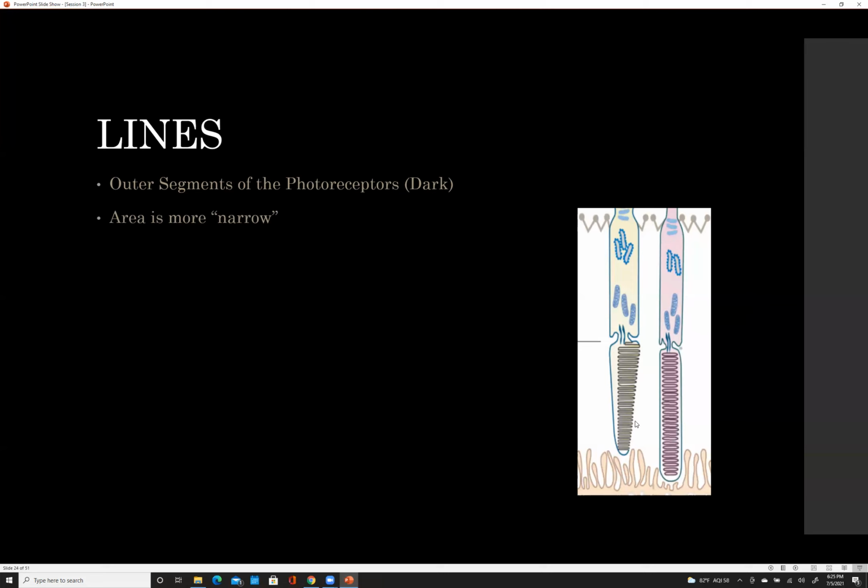But then the second thing I want to explain: remember, if there is light and you see a white layer, then a white layer means that there was reflectance. But if something absorbs light, it looks black, just like a black hole. A black hole absorbs light, and thus it's black. Well, in this case, what do photoreceptors do? Where does the light get absorbed? The photon travels all the way down here and gets absorbed here, if it's going to be absorbed by that particular photoreceptor, and then an electrical signal is transmitted, but no reflectance happens if they're working correctly.